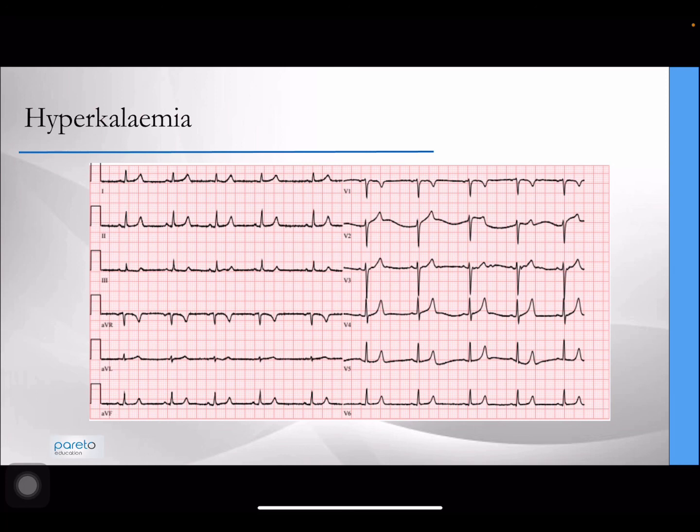And if you see one of those in an ECG, don't always call it hyperkalemia. So that's it really, some simple but critical ECGs that you need to be able to identify.